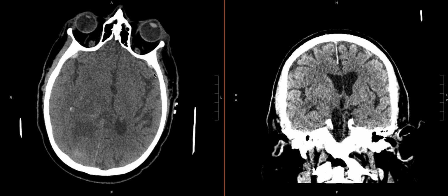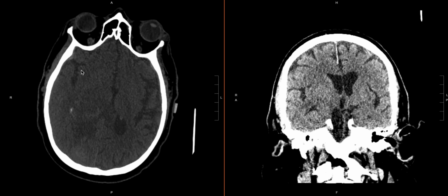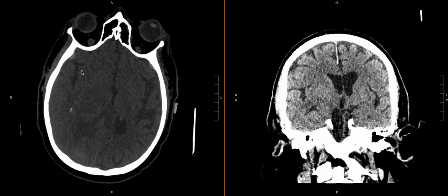And now we can adjust this window a little bit. I like to adjust it slightly, maybe more like this, which will help us with some other blood products. But ultimately, the density of your subdural is going to help inform which subdural window is best. This one is closer to a 90-200 for the level and window. But regardless, a 60-160 is a very reasonable place to start, and then you can window and adjust manually to make these extra-axial spaces appear as prominent as possible.